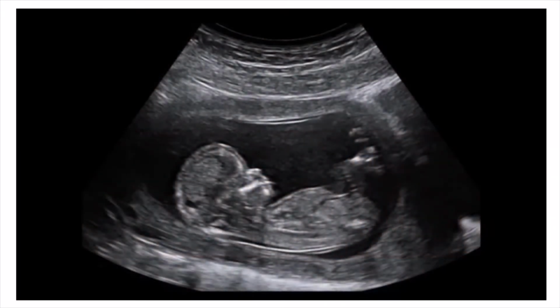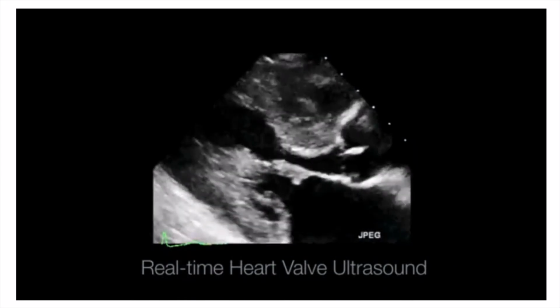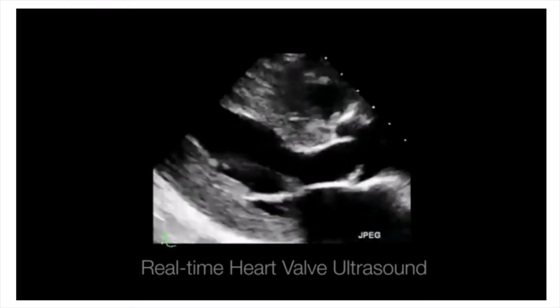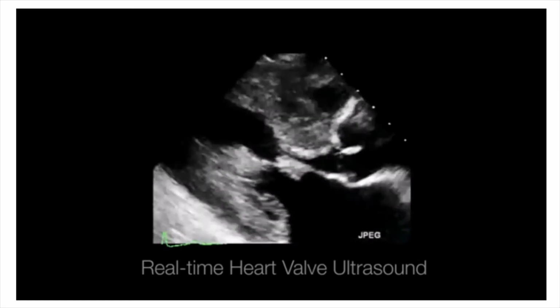A medical transducer contains a large array of crystals, which allow it to make a series of image lines that, together, form a complete image frame, called a sonogram. In addition, all the crystals are repeatedly activated many times in such a way that a complete image frame is formed around 20 times per second, so that real-time motion is displayed in the ultrasound image.